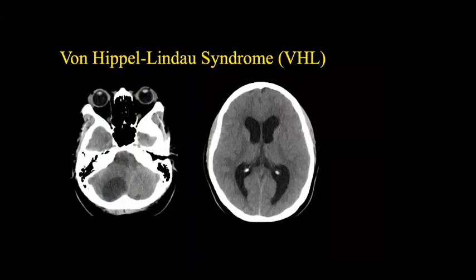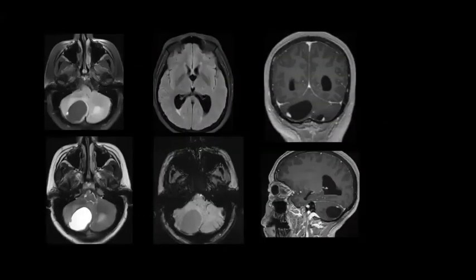Okay, so yes, it's a case of von Hippel-Lindau syndrome. That's the CT appearance for the patient. So just cystic lesions, but also there is supratentorial ventriculomegaly. And usually the patient will present with the CT. And then for the MRI, you see the cyst and nodule with the surrounding edema. Because of all these changes within the posterior fossa, it narrowed the fourth ventricle, resulting in supratentorial ventriculomegaly, and then the transependymal or periventricular interstitial edema.